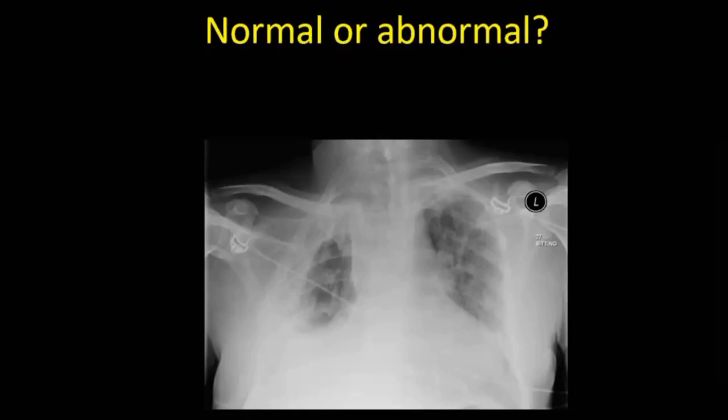It could be due to some underlying post-operative complications, like some infection. Okay, what kind of infection? Likely due to air-producing organisms. Excellent, yeah, possibility. Any other possibilities? There could be some superimposed surgical emphysema that might reflect as this air. There can be a bronchopleural fistula formation.